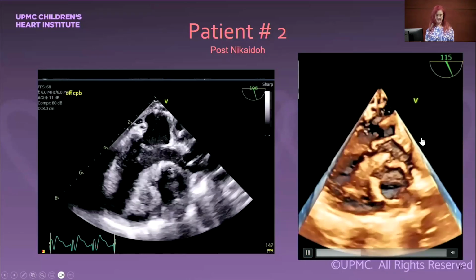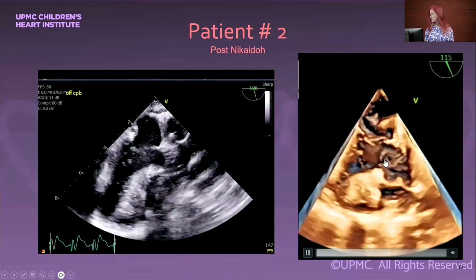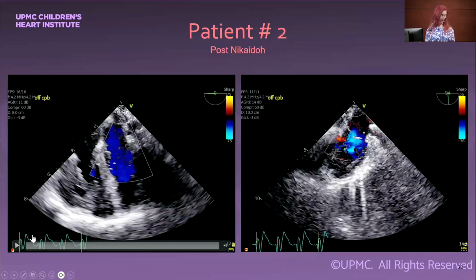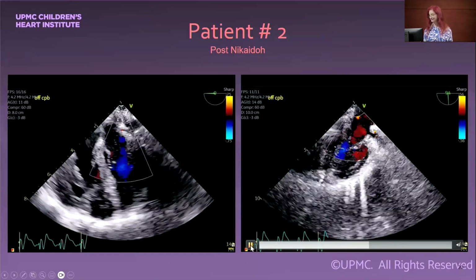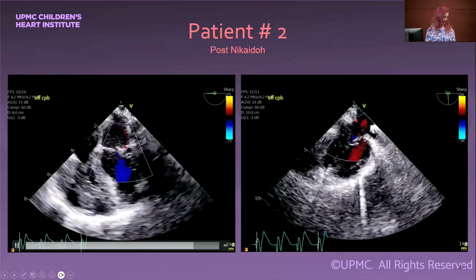Here is a 3D picture of it, which I think is nice because, again, it shows you with depth that there is no tissue there remaining. And the aortic valve here is off the screen. Again, not part of the surgical thing, but the mitral valve worked just as well, if not a little better, post. So there was really no damage to the mitral valve with this surgery.